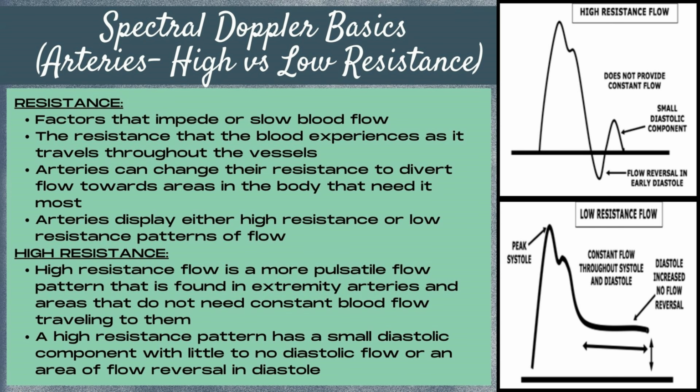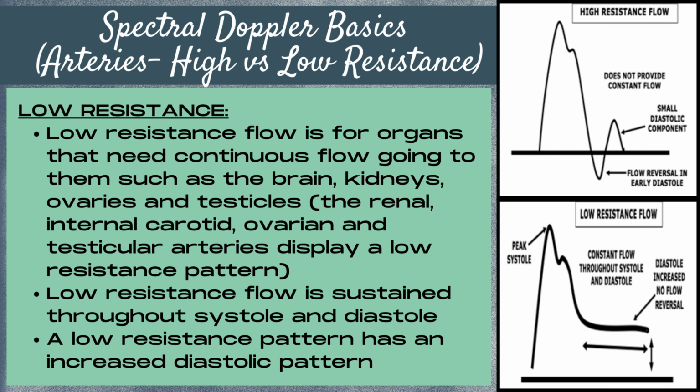A high resistance flow pattern is a more pulsatile flow pattern that is found in extremity arteries and in areas of the body that do not need constant blood flow traveling to them. A high resistance flow pattern will either have little diastolic flow, no diastolic flow, or an area of flow reversal in diastole. Low resistance flow is for organs that need continuous flow going to them, such as the brain, kidneys, ovaries, testicles, etc.